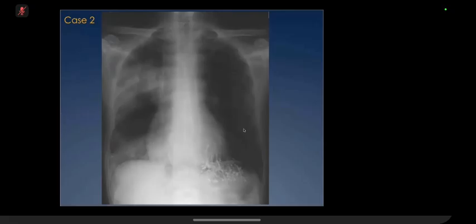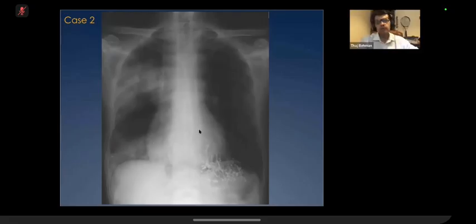Is there an esophageal stent? Yeah, there is an esophageal stent. The purpose of this radiograph is similar to the previous migrated esophageal stent. Get your eyes used to seeing esophageal stents and think about them. So what could be happening in this case? Can you put everything together?